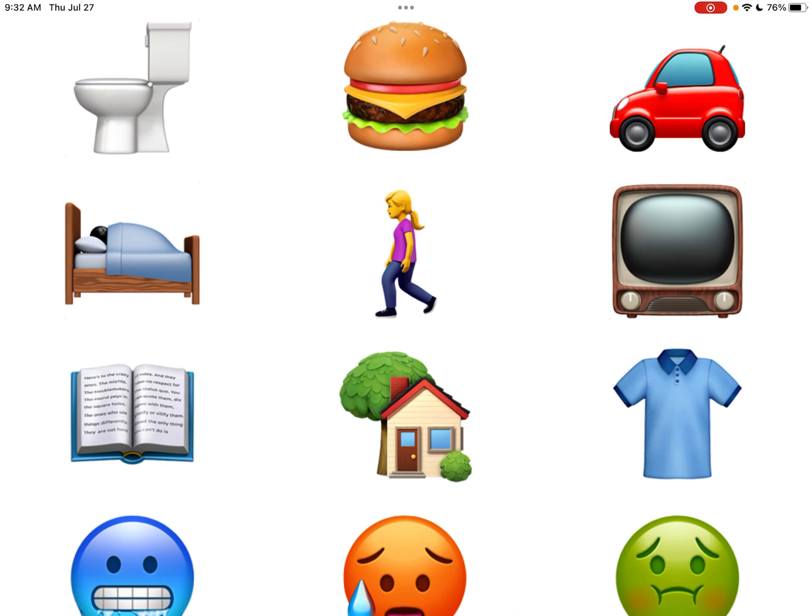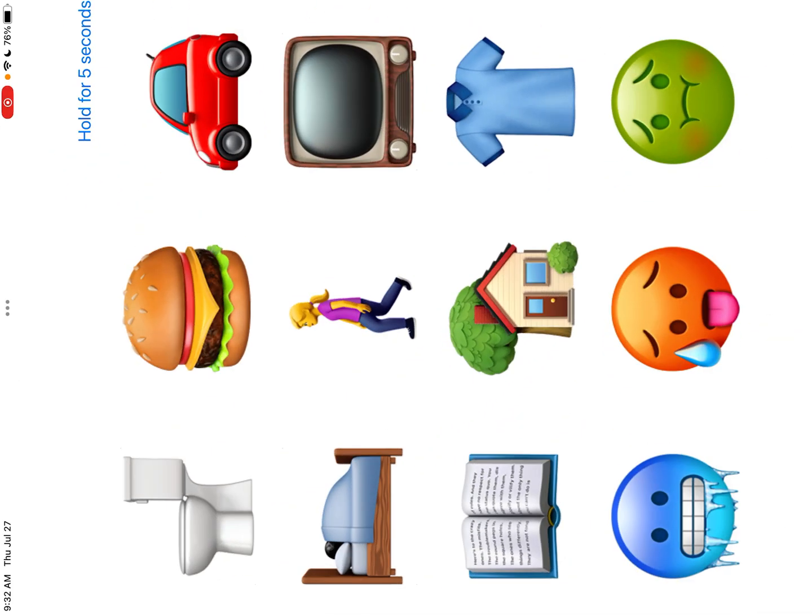Nonverbal Speech Communicator, I think this one's called. It just has a grid of 3 by 4, and the only option here is to use emojis. But if you have someone who's into that, they're not labeled, so they need to be pretty apparent to that person. Car. Food. And you can edit if you hold down.